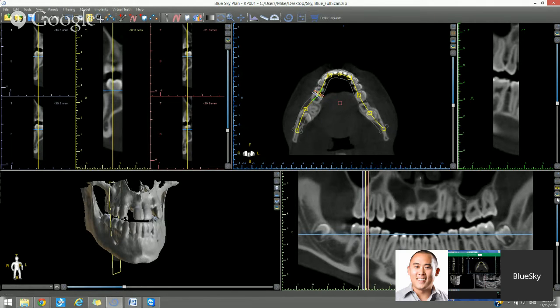Now, you can also notice that every view has a picture of a camera next to it. And what that does is it will take a screenshot of that particular view and put it into your screenshot basket. We're going to discuss a bit later the screenshot and report generation functionality. There's a great functionality built into the software that allows you to create a PDF, include drilling report information, include CT scan reports, and a whole bunch of other things, which we're going to get to in just a bit.